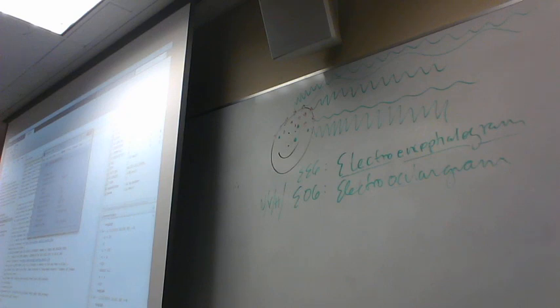4 hertz is about delta. From 4 to about 8 hertz is theta. 8 to about 12 is alpha. And then 12 to about, I don't know, 30 or so, if I think off the top of my head. No, it's beta up here. And you can see different patches of that at different times. So the brain oscillates in different frequencies over time. This is a general overview. We'll get into this in more specifics.